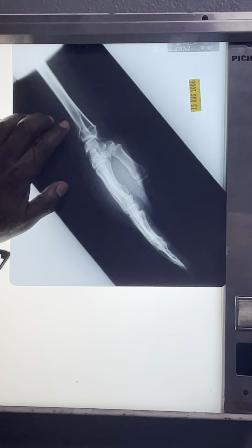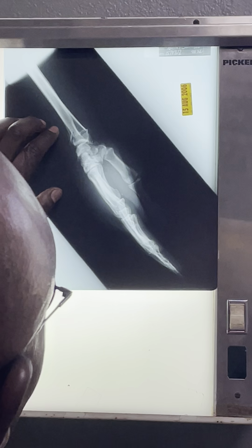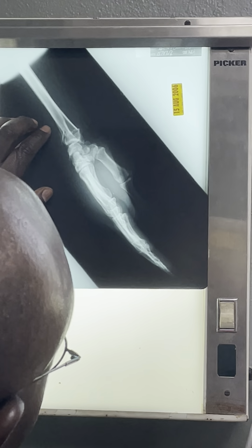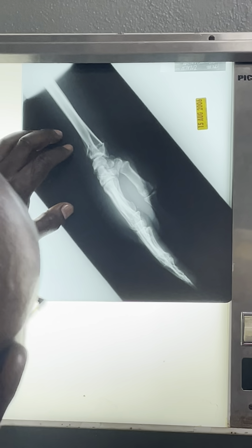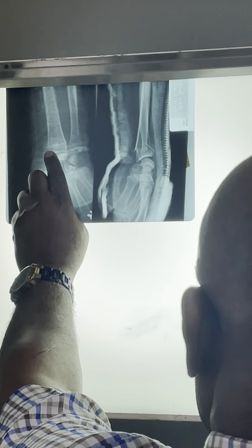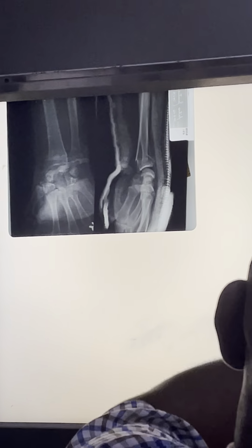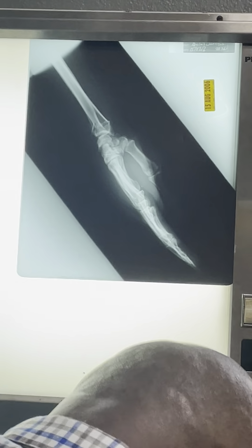You should see that. But the fracture, remember I said again, it gets posteriorly shifted and tilted, laterally shifted and tilted. You see what's over there? Laterally, toward the thumb, laterally shifted and tilted. Impaction. You see how it's going into the fracture, where the fragments jam into each other. You can show where it's posteriorly.